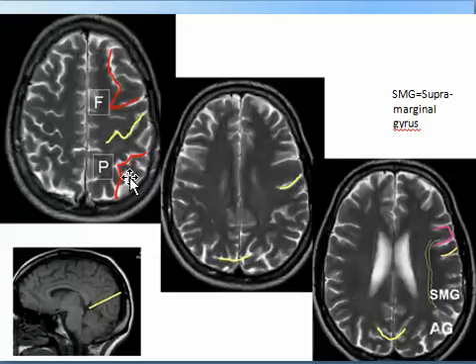This is the frontal lobe, this is the parietal lobe, and this is the central sulcus. This is the parieto-occipital fissure, and this is the occipital lobe, most posterior. And if you draw a line obliquely about 15 degrees from the horizontal, starting from the region of the corpus callosum splenium up posteriorly, you will pass eventually in the parieto-occipital sulcus.